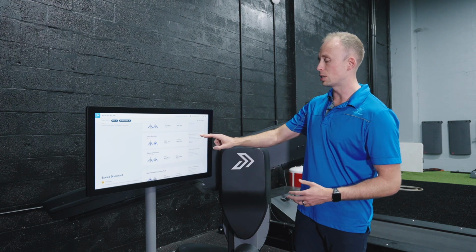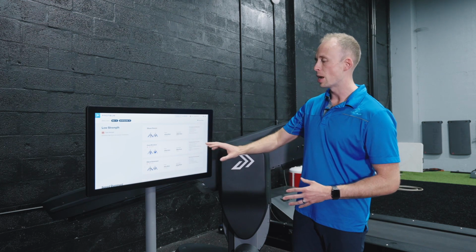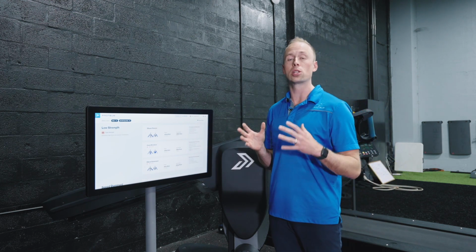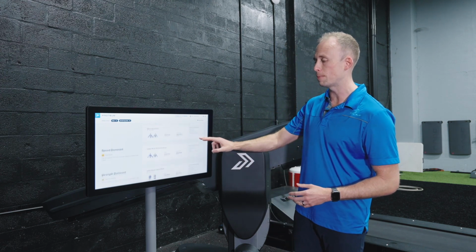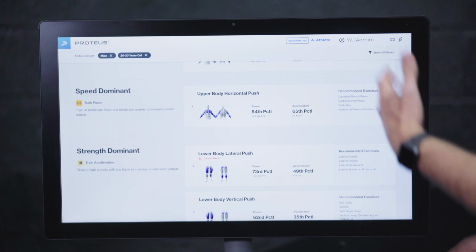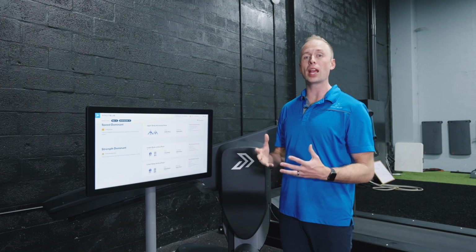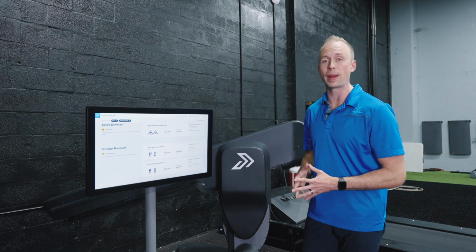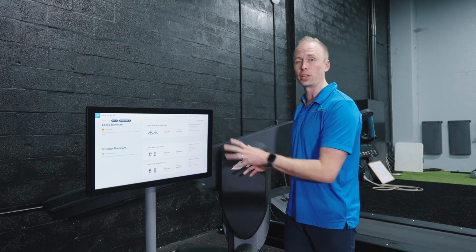And you can do the same thing by looking at elbow extension exercises and elbow flexion exercises, and they'll all be in that high force, low velocity category of the type of exercises selected. But then obviously if you go down to speed dominant and strength dominant, the exercises will scale to be more along the force velocity spectrum that is required to improve that particular movement category.